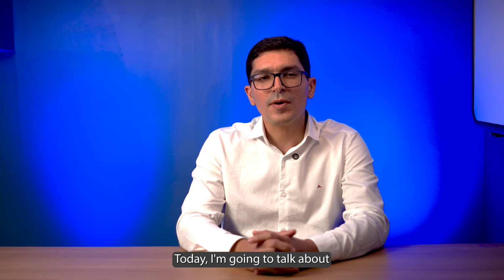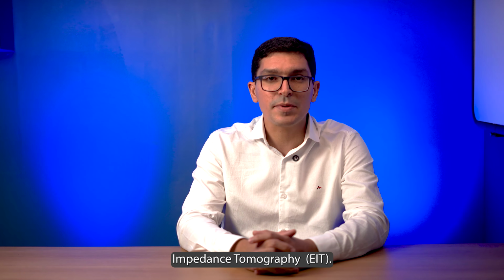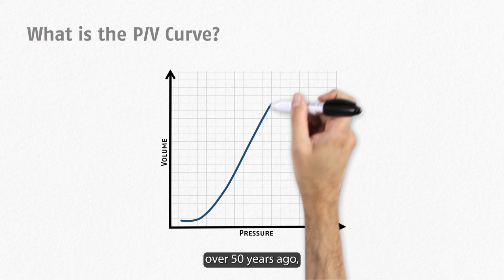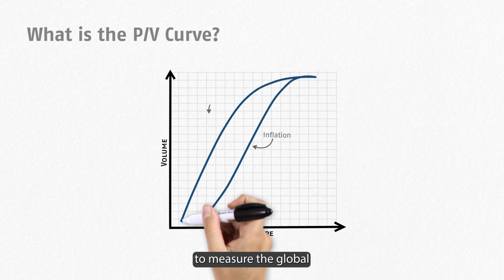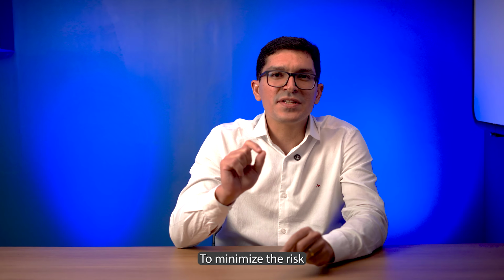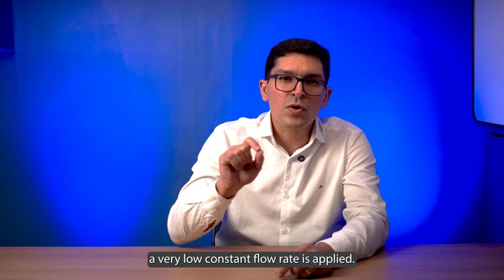Today I'm going to talk about how to set PEEP using pressure volume curves and electrical impedance tomography. The pressure volume curve is a method introduced over 50 years ago to measure the global elastic properties of the lung. To minimize the resistive factors of the tracheal tube and airways, a very low constant flow rate is applied.